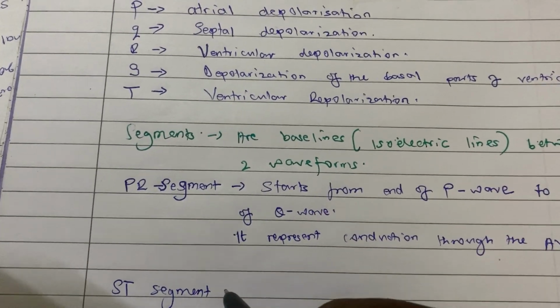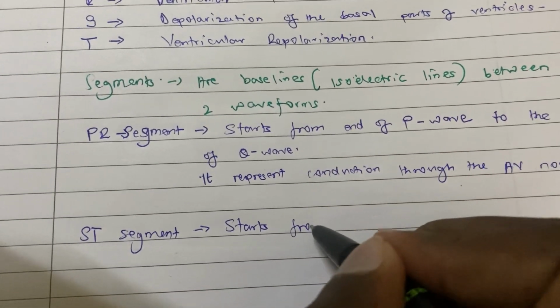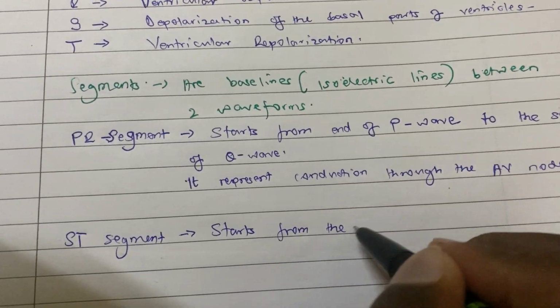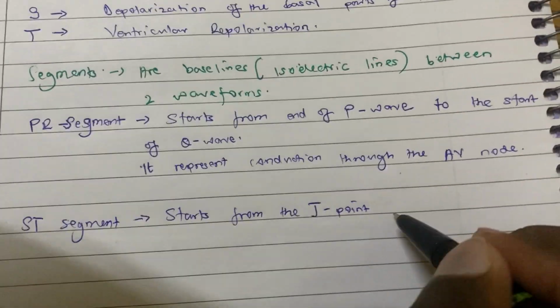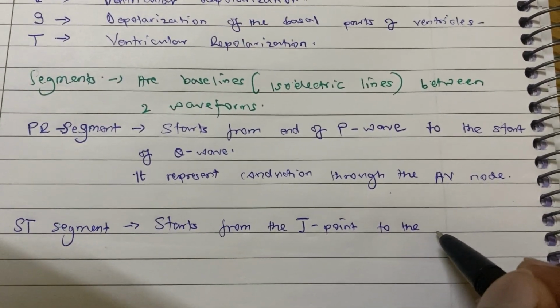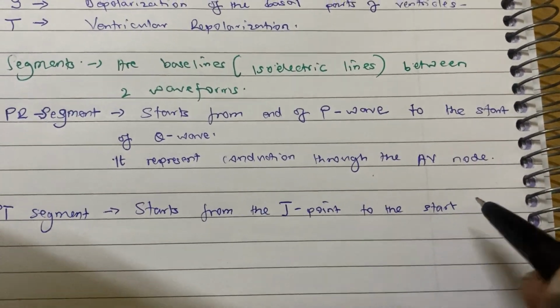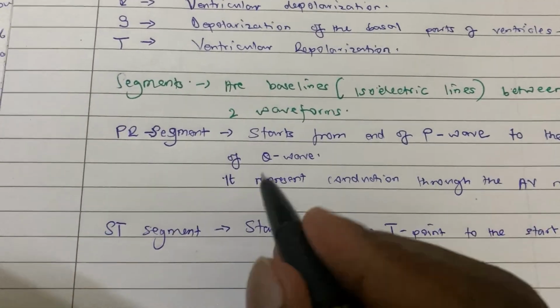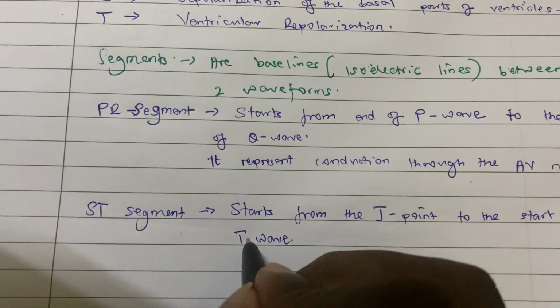ST segment, it starts from the J point to the start of T wave.